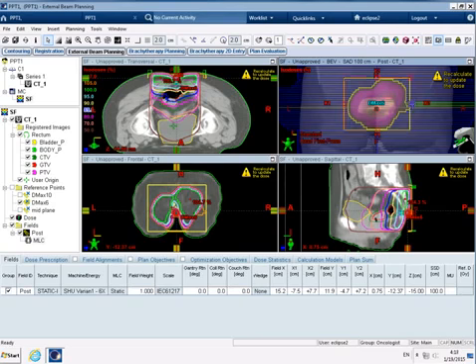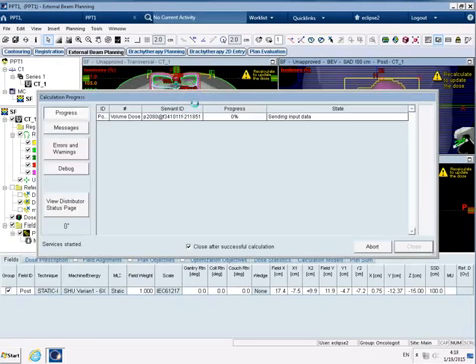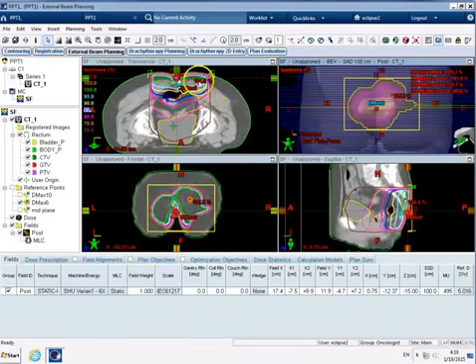In fact, what I'm going to do is just open it up quite a bit just to emphasize the point for you. So I'm going to open that leaf up, and can you see as I do that up here, that that's doing that. So then when I calculate the dose now, the dose is going to bulge out here. So let's hit F5 and see what that does. Yeah, so it's done that there, hasn't it?